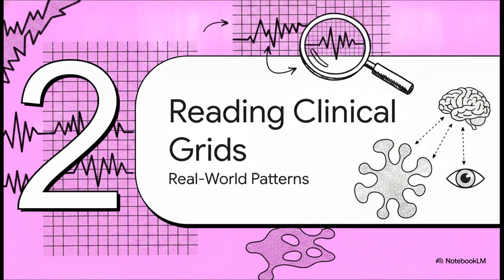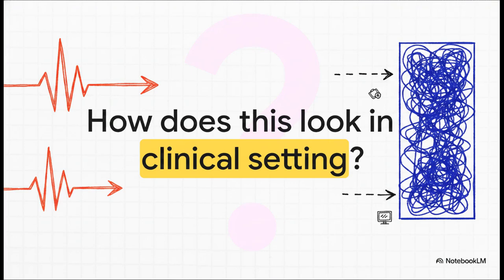Moving on to Section 2, reading clinical grids. Time for some real-world patterns. We've nailed the foundational rules on a highly simplified, clean, white graphic, which naturally brings us to our next question. How does this look in an actual clinical setting? Because it's one thing to spot the pattern when it's hand-drawn for you in bright red ink, but what happens when we throw in the intimidating density of a standard clinical readout?